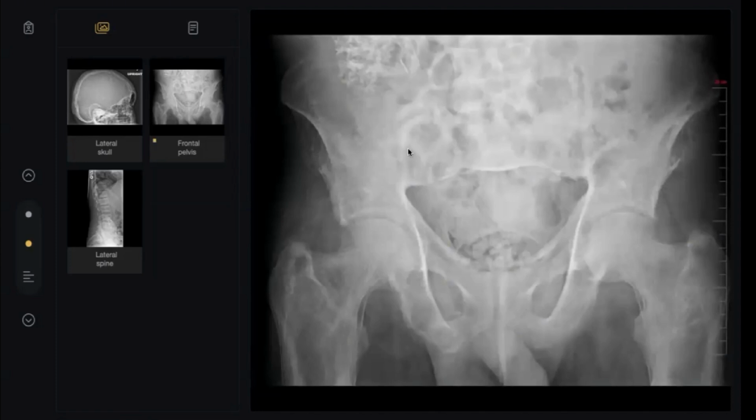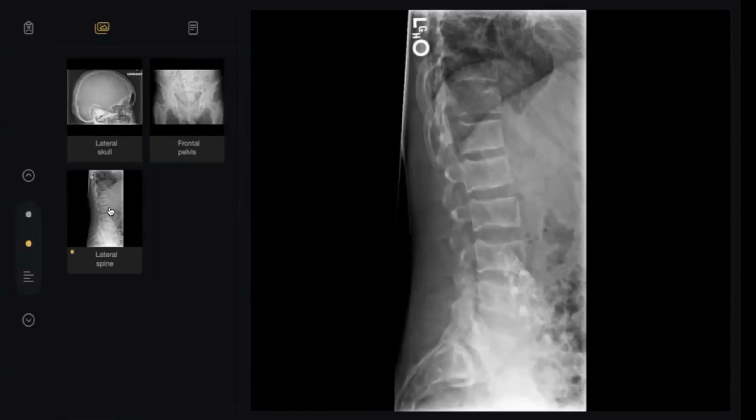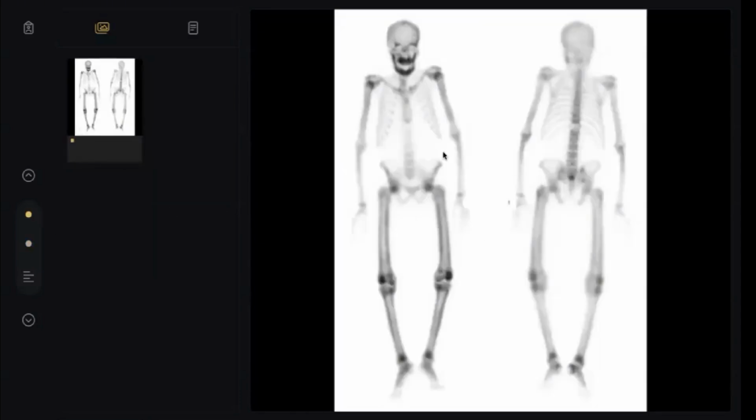Okay, look here also. Someone has been transplanted here and then it is rejected. What is this? Transplant kidney rejection with calcification. So what is this? Renal osteodystrophy. Excellent. So this is a super scan due to renal osteodystrophy. Okay. Thank you, doctor, so much.